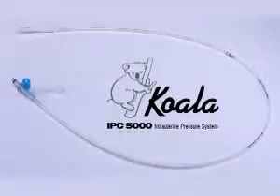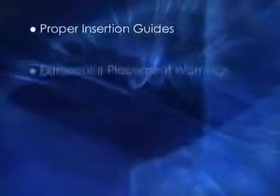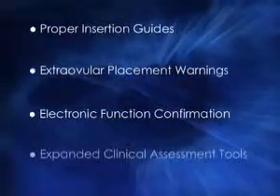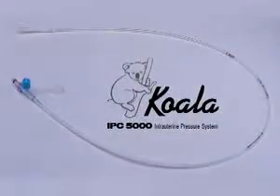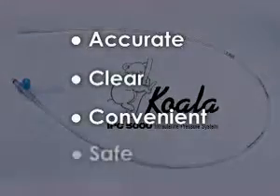The Koala provides advanced technology and safety features that result in comfort and safety for both mother and baby. With its proper insertion guides, extraovular placement warnings, electronic function confirmation, and expanded clinical assessment tools, the Koala makes intrauterine pressure monitoring accurate, clear, convenient, and safe.